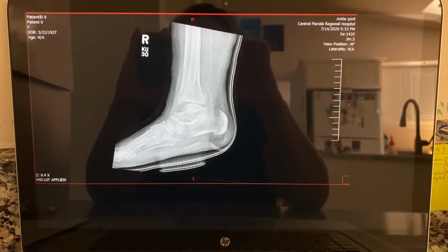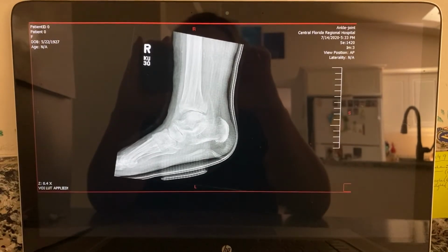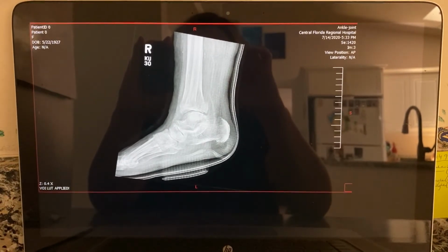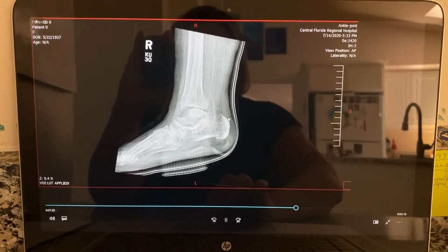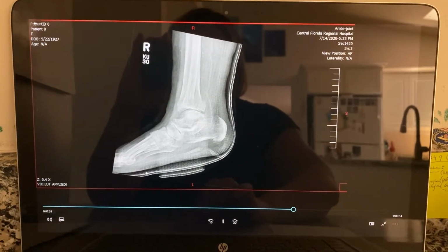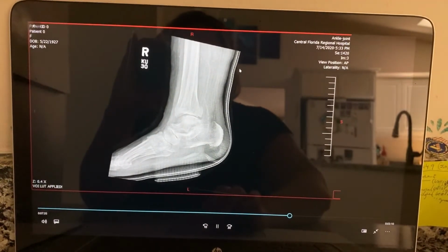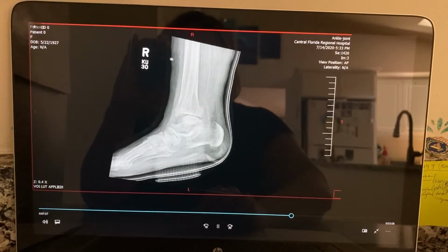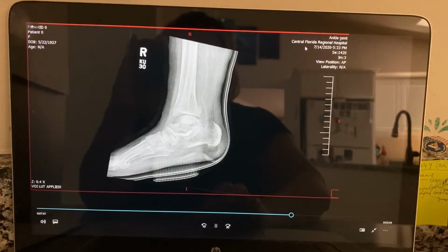For the last image of the 93-year-old female post-reduction trimalleolar fracture patient, no removable artifacts are seen on the image, but the overlying cast is present. This reduced the detail of the soft tissue and bony trabecular markings. The right marker is present, and the patient's PII has been removed from the image.